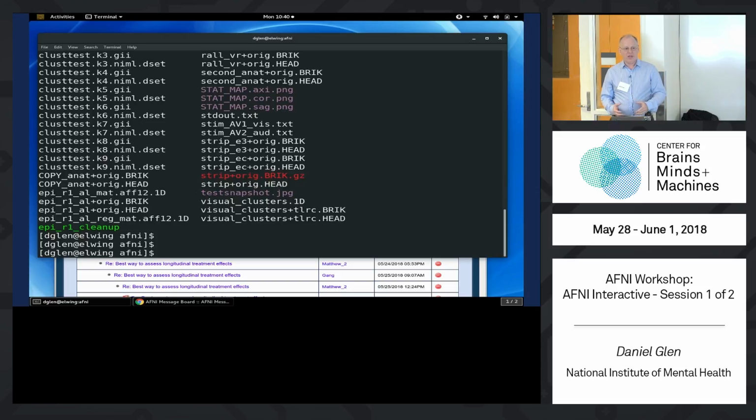You can call it from another directory, and we could have started it on the command line and said afni AFNI_data6, what directory we want, and then it would start AFNI on that directory, or we can have it recurse through a bunch of directories. Go find me all the directories that have data from the current directory downward, and these would all show up as sessions inside AFNI.